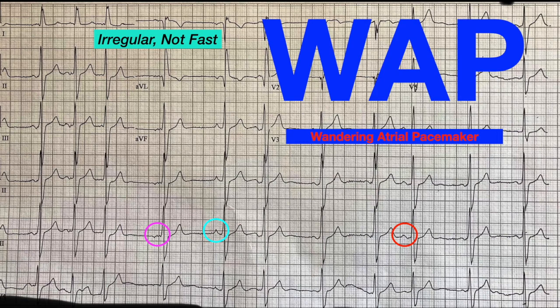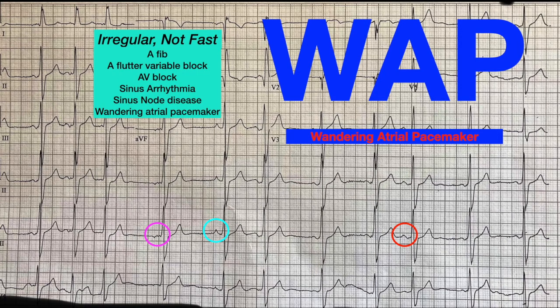You don't see that real often. When you do see it, it's probably going to be in an older person with fairly prolonged, advanced COPD. By the way, when you're looking at the differential for an irregular rhythm that's not fast, there's not that many things in it. It could be AFib, it could be a flutter with a variable block, could be AV block of some kind. These are all irregular beats. What makes the heart beat irregularly but not necessarily super fast? Those things, sinus arrhythmia, and then the one that you don't see real often is that wandering atrial pacemaker. So that fits in with our differential diagnosis for irregular and not fast in terms of your rate and rhythm.